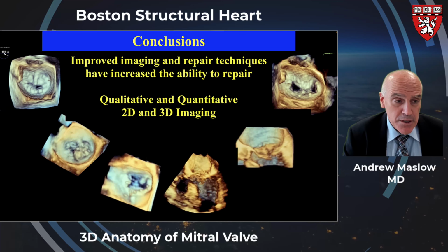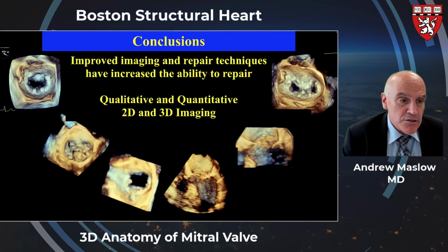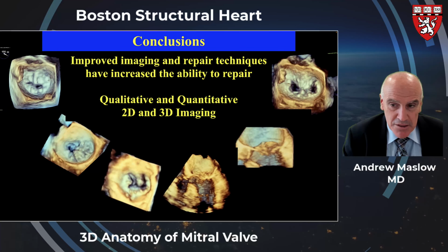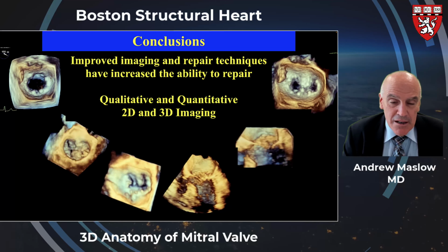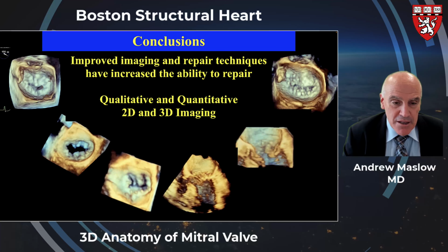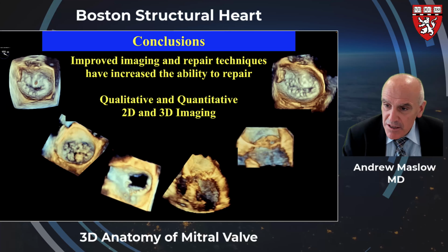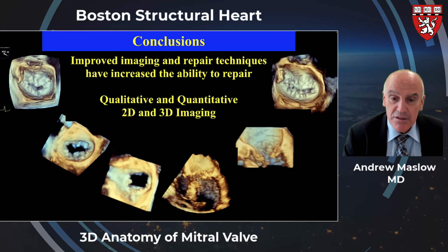In the top videos on the left and the right, you can see also what looks like two-leaflet prolapsing disease, and then two mitral clips placed. Your imaging should combine two-dimensional and three-dimensional imaging and optimize your frame rate and resolution to afford you the best results.